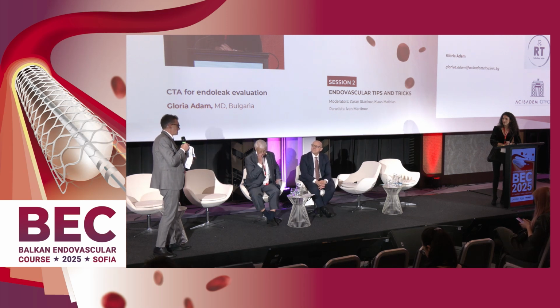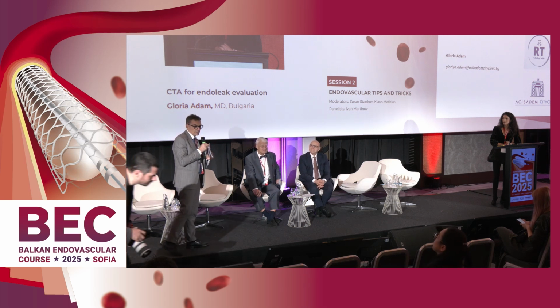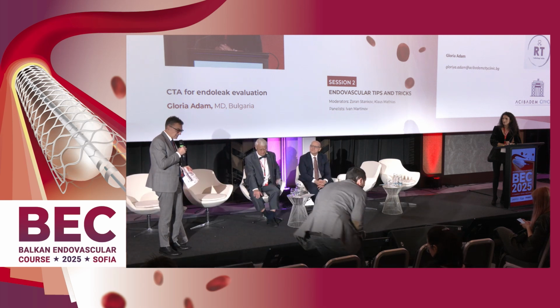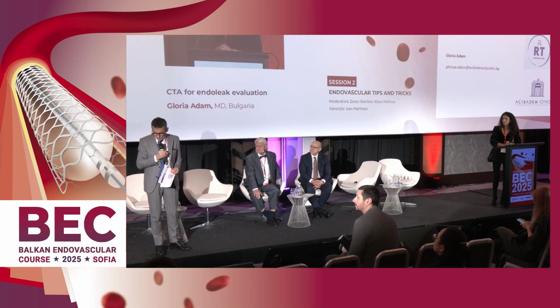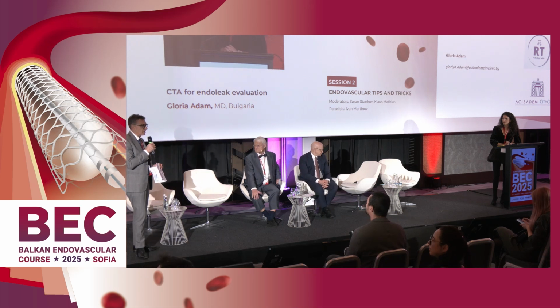And it is, in fact, in a patient, a medical doctor, who didn't make surveillance imaging for 5 years. And nowadays he has, and Dr. Janevska will show, it's probably a good idea to show the case, in order for you to be aware.